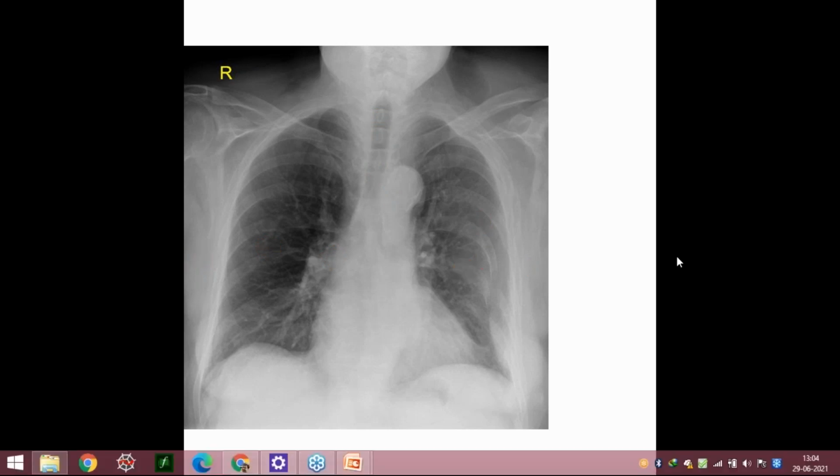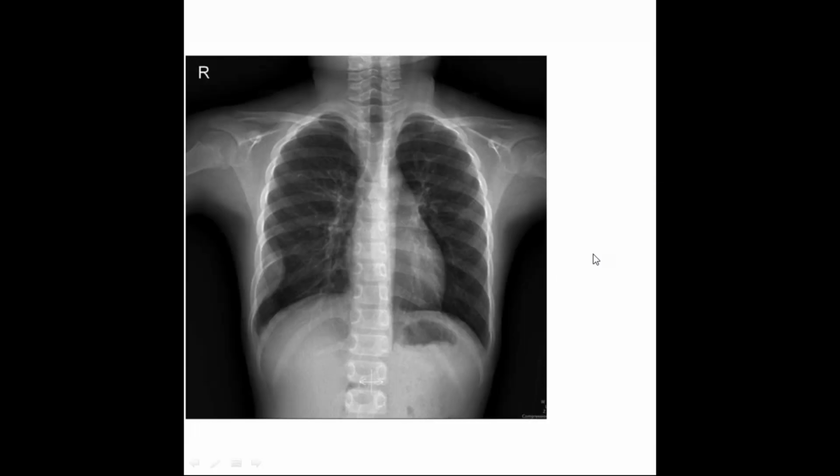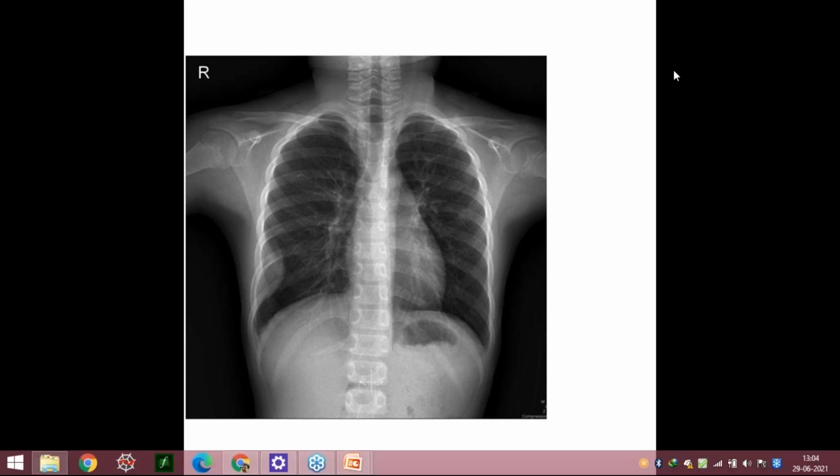Okay, so we then move forward to another X-ray. Okay, what is this? I don't think so. I'll be extending up to 2 because there are now few X-rays only. But okay, so what is there in this X-ray? Loculated effusion on the right side. Okay, one differential, right subpleural thickening, good. That is good.